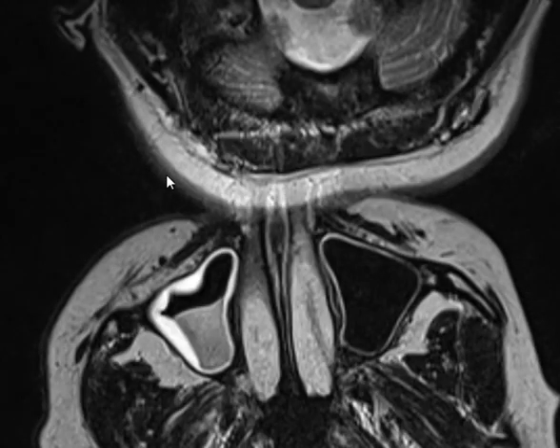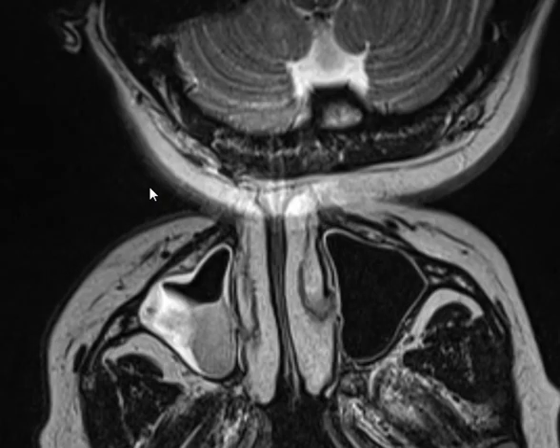First of all, before we continue, why is this image half down, half up? What's that? Wrapping artifact, or fold over artifact. And how do you solve that? You increase the field of view.